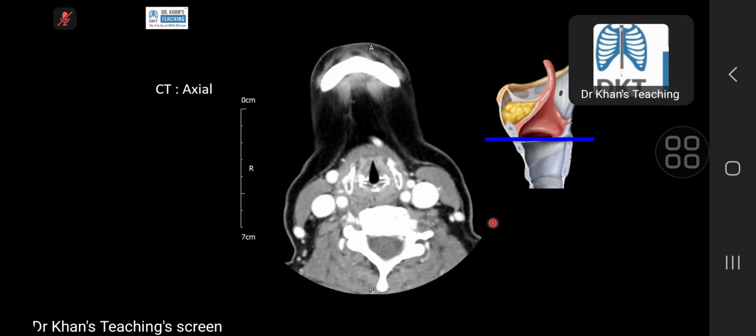If you ask me, just tell me one thing about the radiological anatomy of larynx, I will again emphasize on this. Develop your eyes to pick up the true chord level, and the formula is that you will see two cartilages, arytenoid and cricoid, and then the airway will be boat shape, and this is passing through that.